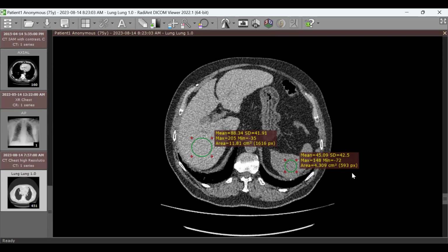And now you can see why we focused on ICD versus permanent pacemaker. When I saw this patient, they were asking only whether there is ILD, and that's it. So we have asbestosis, and we have another reason within the differential diagnosis of a lower zone UIP pattern, which is amiodarone toxicity. Because the patient had arrhythmia, ICD since 2015, and we have a clear difference in density.